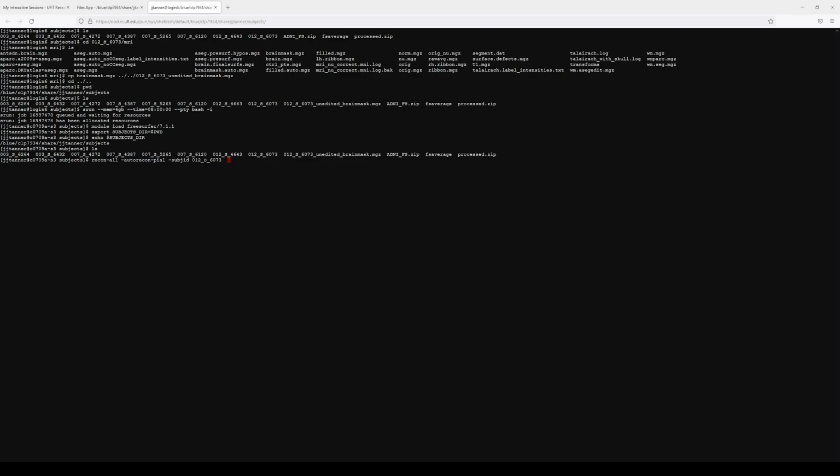So in this case, because I'm doing this interactively, I would keep this window up and everything just to be safe. I haven't tested what would happen if I leave the window, not meaning I could click over to something else, but not close the tab. But that would be reprocessing. But again, I recommend just using a script.